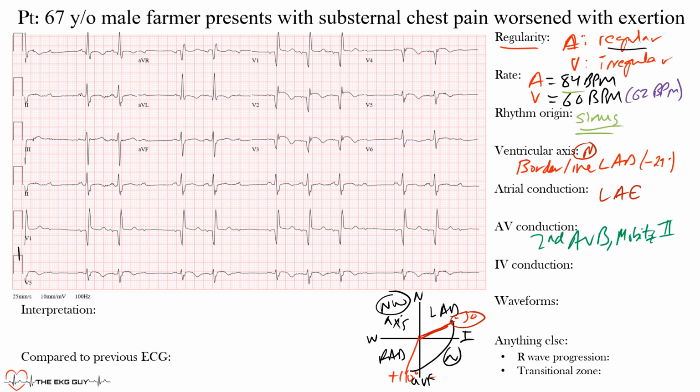All right. So let's move on to IV conduction. IV conduction, I'm pretty much looking at these QRS complexes. IV meaning intraventricular. What is the conduction within the ventricle? So here you want to look at the duration of the QRS complex, okay? Normal duration is between 70 and 110 milliseconds, or less than 3 small boxes. Once you start hitting 120 milliseconds or more, we start considering this abnormal. Okay, and I was reading another book today that even put it up to 100 milliseconds. So anyways, less than 120 milliseconds is what most references will consider normal, and we're going to stick to that.